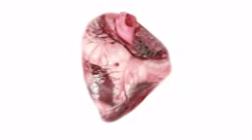The regions where you see the epicardial fat very frequently is right here in the groove between the atria and the ventricle, and very frequently you would see it here at the bottom of the heart and sometimes also located close to the left atrial appendage. One feature of epicardial fat is that you don't see very much of it in the region of the atria. So if you have a structure there, very likely it is not epicardial fat, but something else.